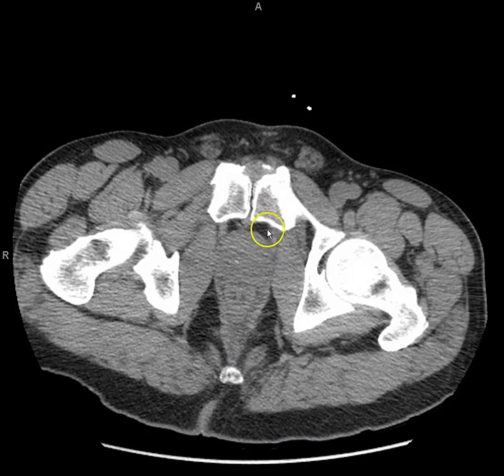This rectal sling, or puborectalis sling, is the reason that people poop better when they squat rather than standing or sitting. Why is that? Because in the squatting position, the sling relaxes to straighten out the rectum and allow it to open. And in a more upright position, the sling pulls forward and helps create an angle by the sphincter to give you more tightness and continence.